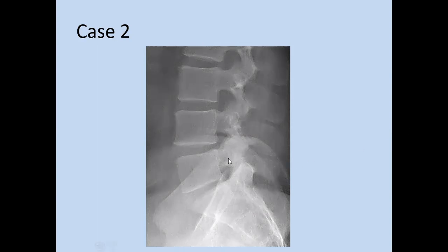Okay. So if I ask you a question, if you look at this vertebra, how does it look? Large, like? Yes, large in size, enlargement of the vertebral body, but normal trabecular pattern and normal density. This we call squaring of the vertebral body shape. Okay. So what is squaring of the vertebra? Yes, expansion, vertebral body expansion.